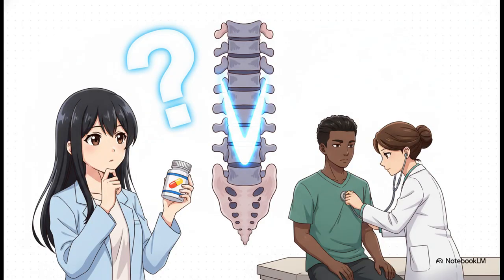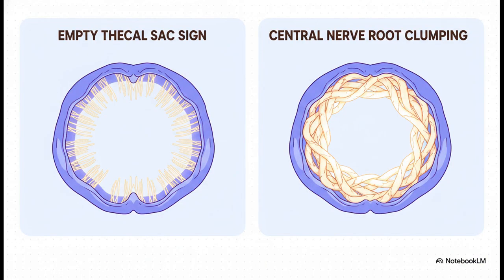Now look at this. You see this inverted V of bright signal in the back of the cord? This pattern can be from 2 totally different things, vitamin B12 deficiency or HIV. On the MRI, they can look identical. This is a perfect example of why we treat patients, not pictures. You cannot solve this puzzle without the clinical history. It's impossible.